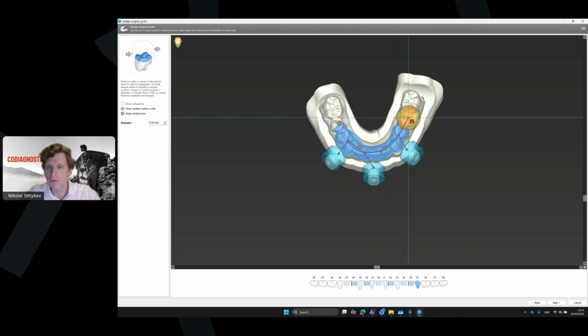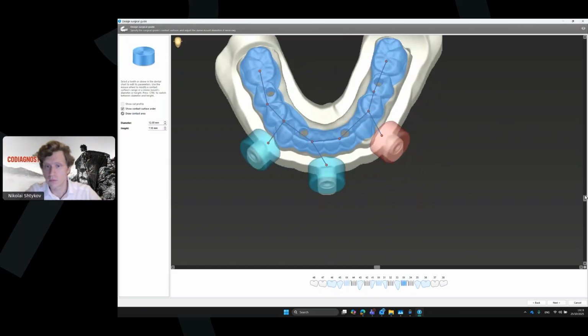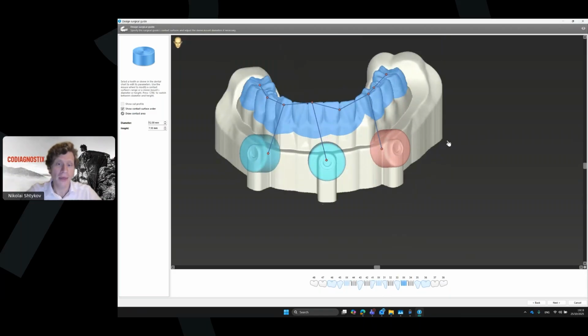And one more. So I think we have one more tooth here. You can make a mixed support on the frame also with the buccal sides here. You could think that it could be a problem that the plastic will be inside of the holes, but no, it won't be. I will show you later why. And here as well, you can use, for example, the draw tool to fix some areas.